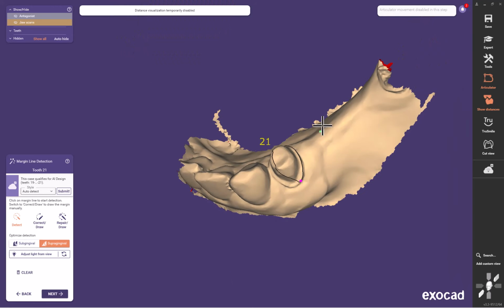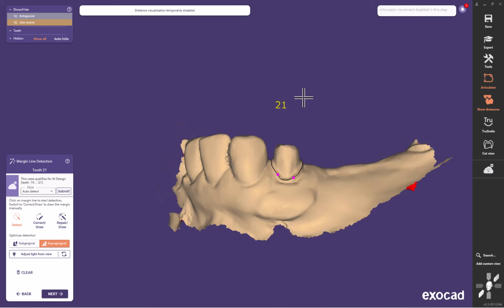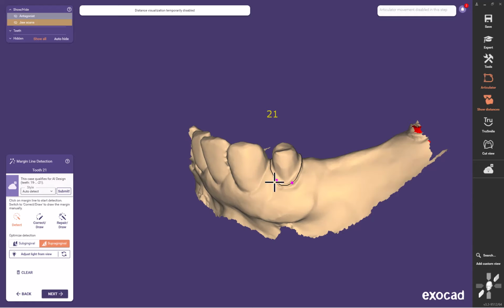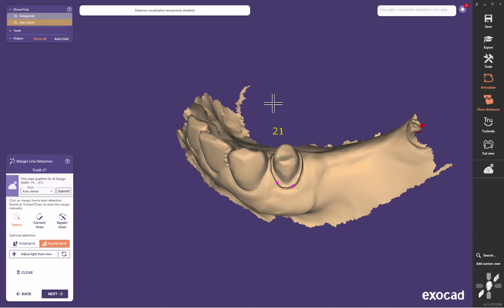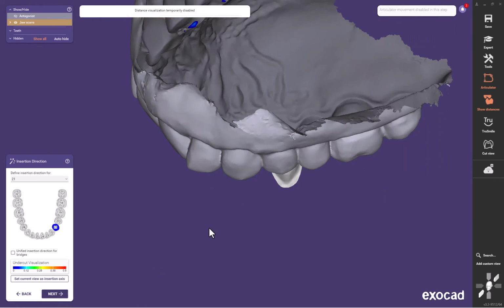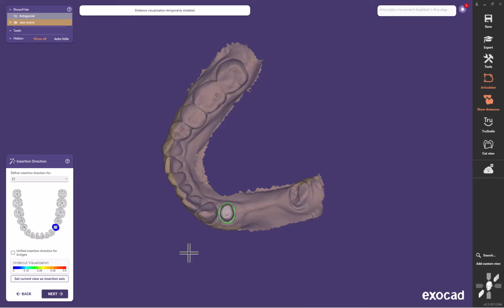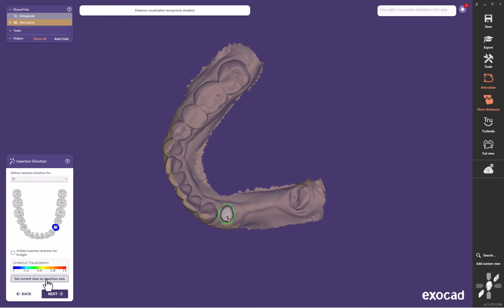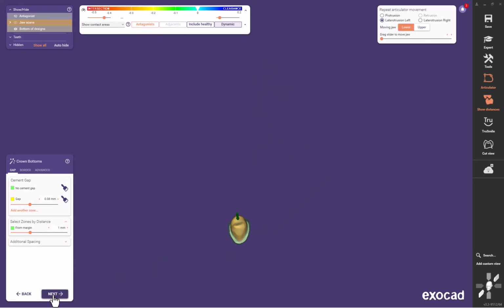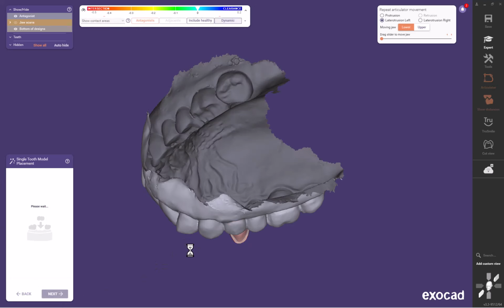So I've actually got this set up to do a temporary crown on this premolar, and that detected that margin fairly accurately. I'll go ahead and pre-print a temporary and have this ready to go when we see her again, and I can cement this in place. So that's getting that ready for a temporary. And now we can add a couple of wax up teeth to the back.